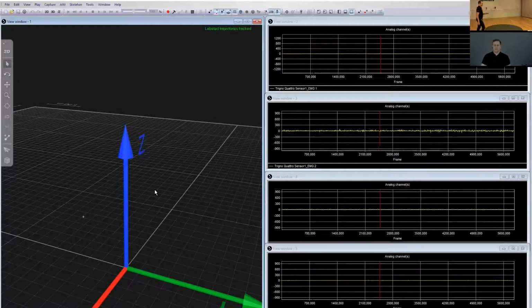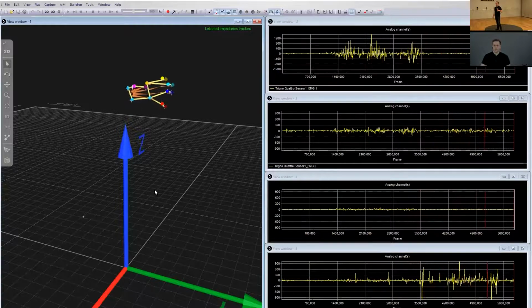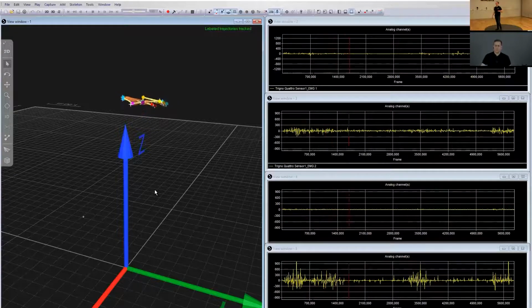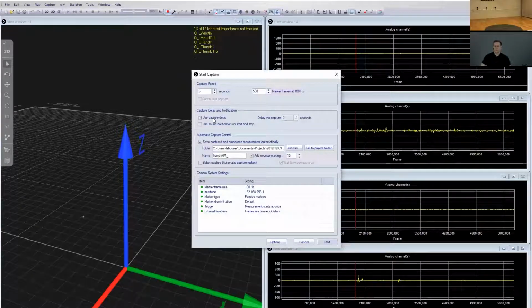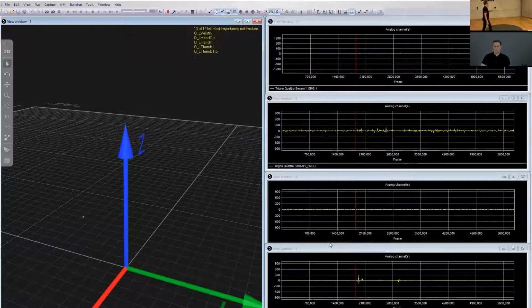And we can see in live preview the hand that is being tracked and the different EMG signals fully synchronized with this. You can see that I've stored a second window layout that we are currently looking at. In that window layout, I've aligned the 3D window on the left-hand side with the EMG preview on the right-hand side. So let's make a recording. I'll just click up here and say 5 seconds, that's fine. We'll remove the delay. I'll just start right away and get here quickly.